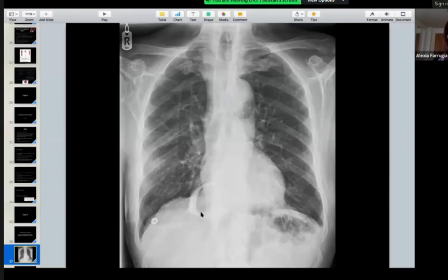So I presume it is appropriately placed. I think it might be too proximal, so it's not appropriately placed. It looks like it's stuck within the post-surgical residual stomach and would need to be advanced further.